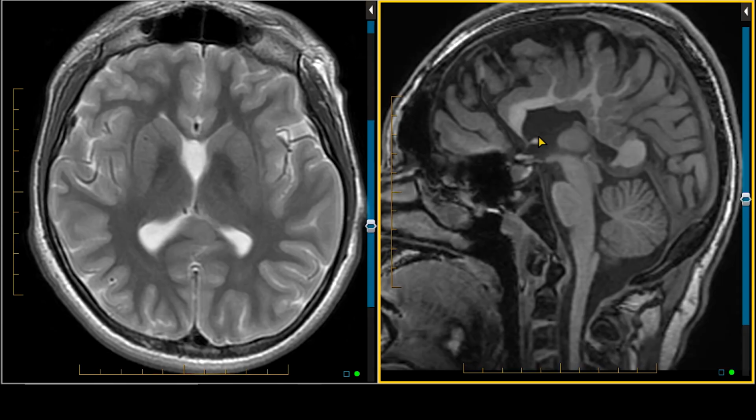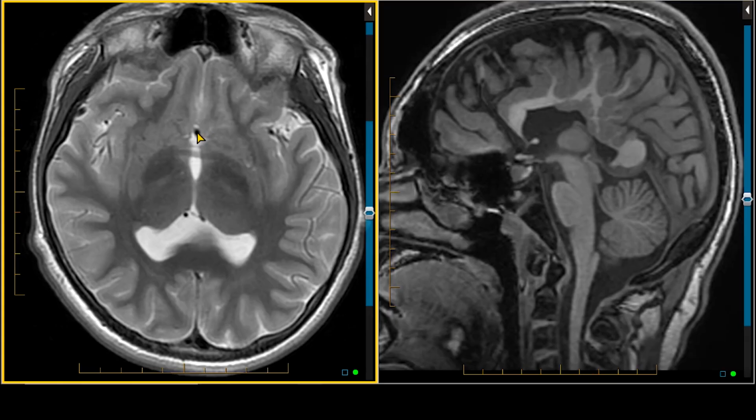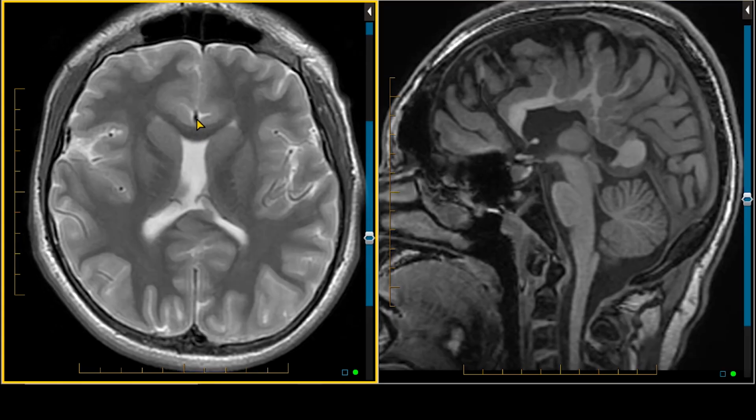It's a milder version even of a holoprosencephaly spectrum disorder. We still see what's an azygous or unpaired anterior cerebral artery and midline continuity of the telencephalon, but we're not seeing all the other features that would make this a true prosencephalic abnormality. So syntelencephaly is an even milder hemispheric cleavage abnormality than lobar holoprosencephaly.